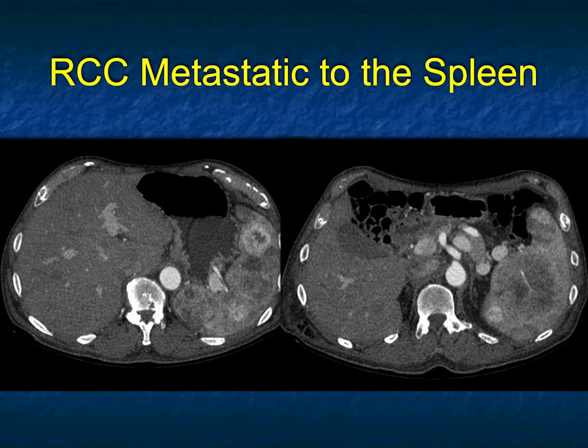This patient had biopsy and eventually surgery. This patient had a renal cell carcinoma which metastasized to the spleen and the pancreas. Just a really nice example. It does make the point that the kidney with clear cell gets all sorts of vascular metastasis. In the pancreas, it's often more than a decade from the original presentation.